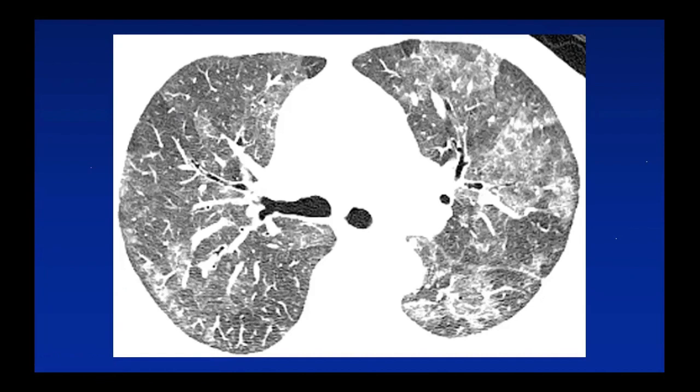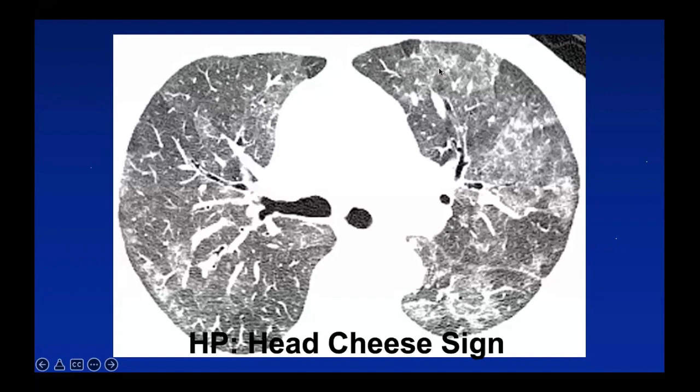But what else do we have? We also see this, the denser area. Look at between the denser area and this part of the lung: the demarcations are not sharp. They're ill-defined borders. So this is ground glass opacity. So the patient has three different densities: mosaic attenuation, more normal lung, and ground glass opacity.